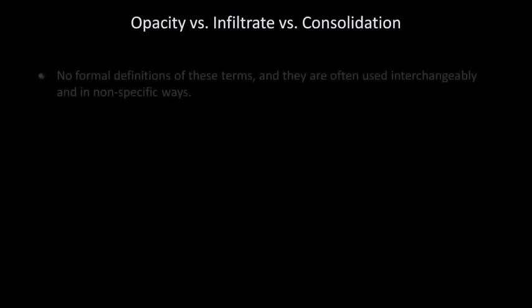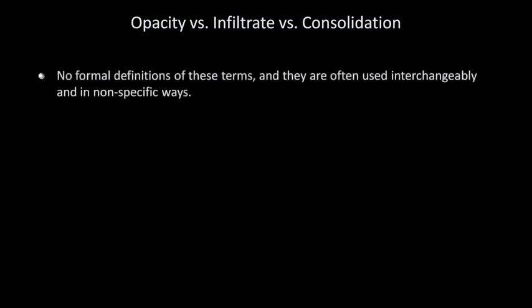So let me now talk about some focal opacities. The first thing to discuss is the distinction between the confusing terms opacity, infiltrate, and consolidation. There are no formal definitions for these terms, and they are often used interchangeably and in nonspecific ways.